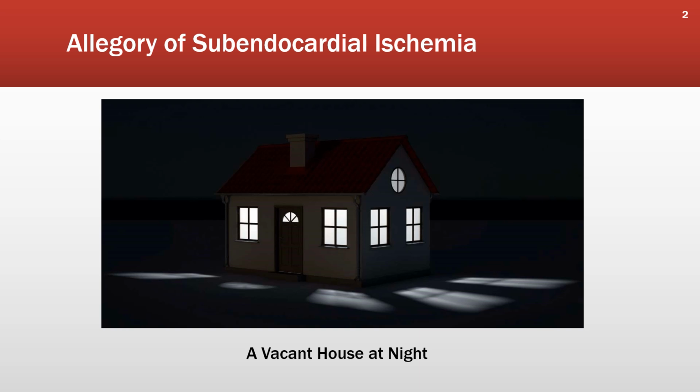The same thing happened with ST depression in leads V4 through V6. Anterolateral subendocardial ischemia, probably chronic, and again, the patient may have been sent home. And of course, ST depression in leads V1 through V4, anteroseptal subendocardial ischemia, and occasionally the patient was sent home.